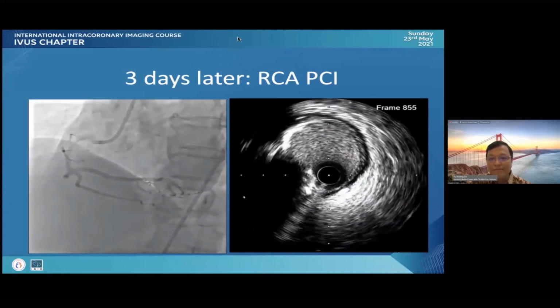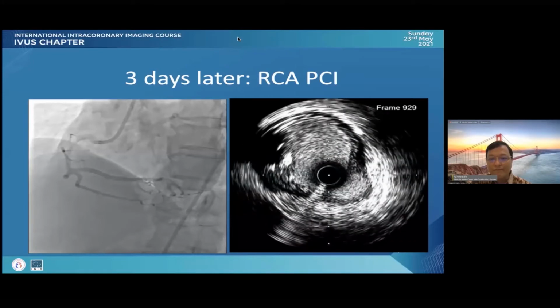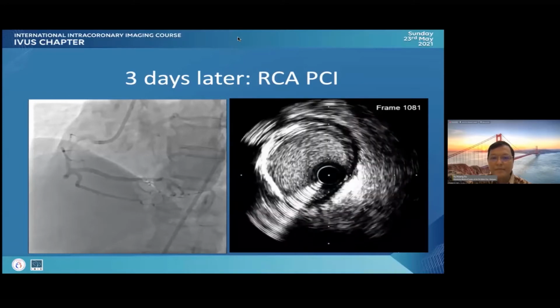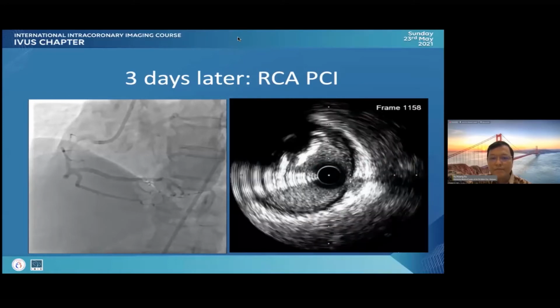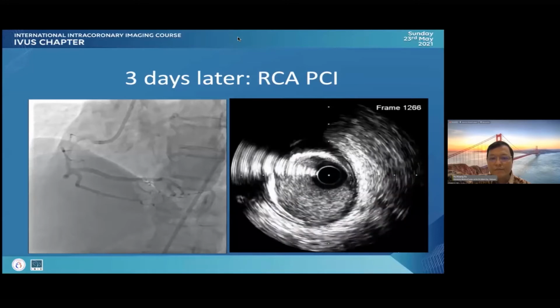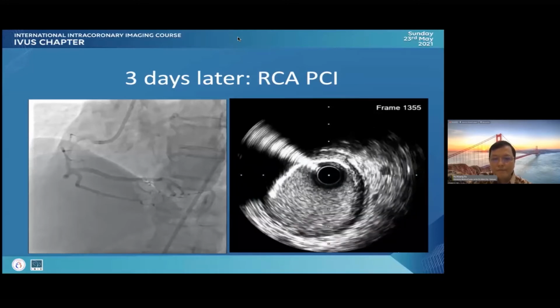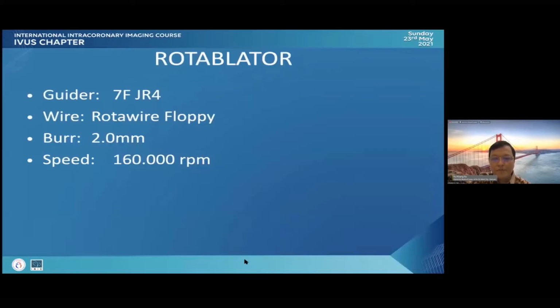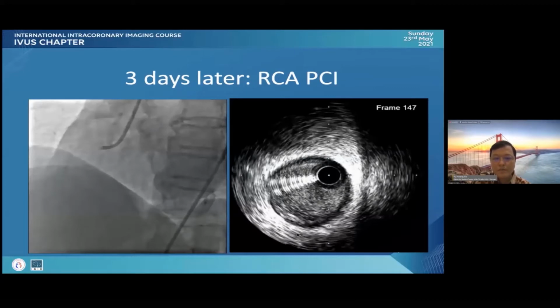There is some haziness starting at the 9 o'clock and coming here. Not yet, but calcium is okay for now. And that's the place where we see the haziness. It's quick, but again, it's a typical calcified nodule. Calcified nodule is very frequent in the mid right coronary artery, and next is the left main bifurcation. So it's really typical, and consistent with what we know in the literature.